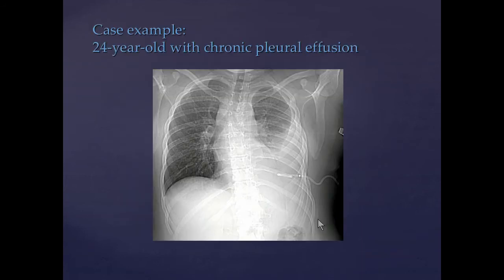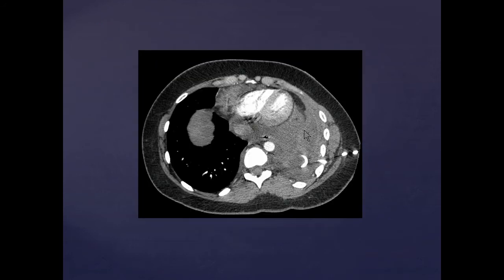Here's a nice clinical example of a woman, a referral from Dr. Roxon. In fact, the next 3 cases will be. Persistent chronic pleural effusions. This chest tube was placed. It drained really well for a while and then stopped, and the CT shows you that it's now becoming quite organized, and you can see some enhancement at the rim.